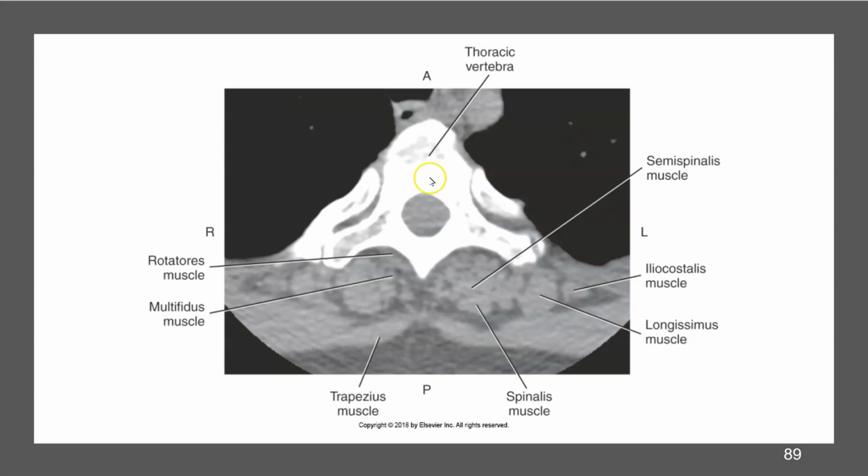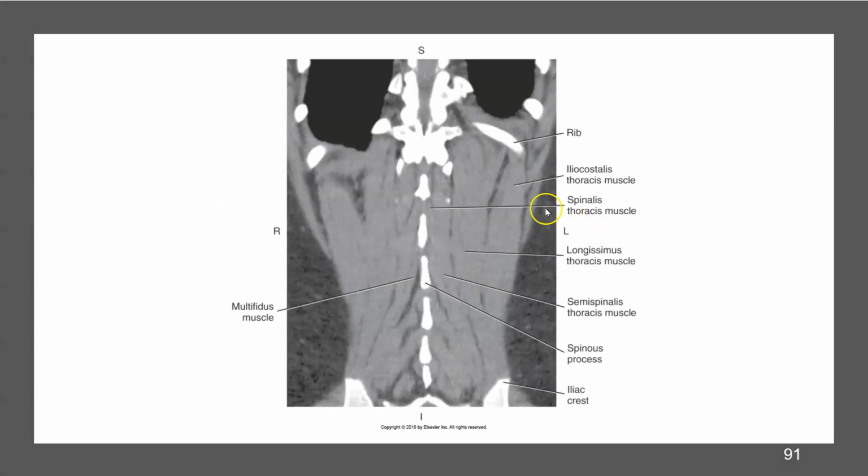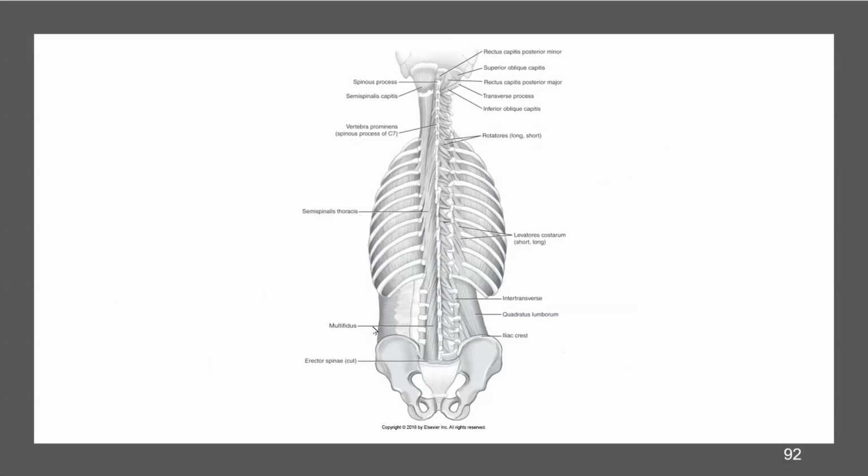Okay, so vertebral body, here's a rib and a rib. So erector, multifidus, and trapezius coming around the back. Hard to tell the difference between the different ones, so I wouldn't ask you on a CT because it's just too hard to see. So this is laid out. You can see little fat bands in between each muscle group. So there you go.